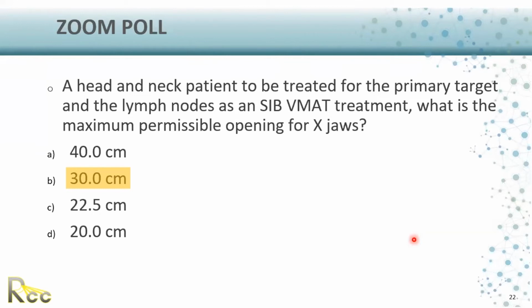Then this is a big issue if you are not sure about the HU values that you are using in your system. So you have to make sure that you calibrate your system, I mean the machine itself, the CBCT, and also your simulator CT. All of these should be calibrated and very close in HU values. Otherwise, you will have a problem with the dose calculation.